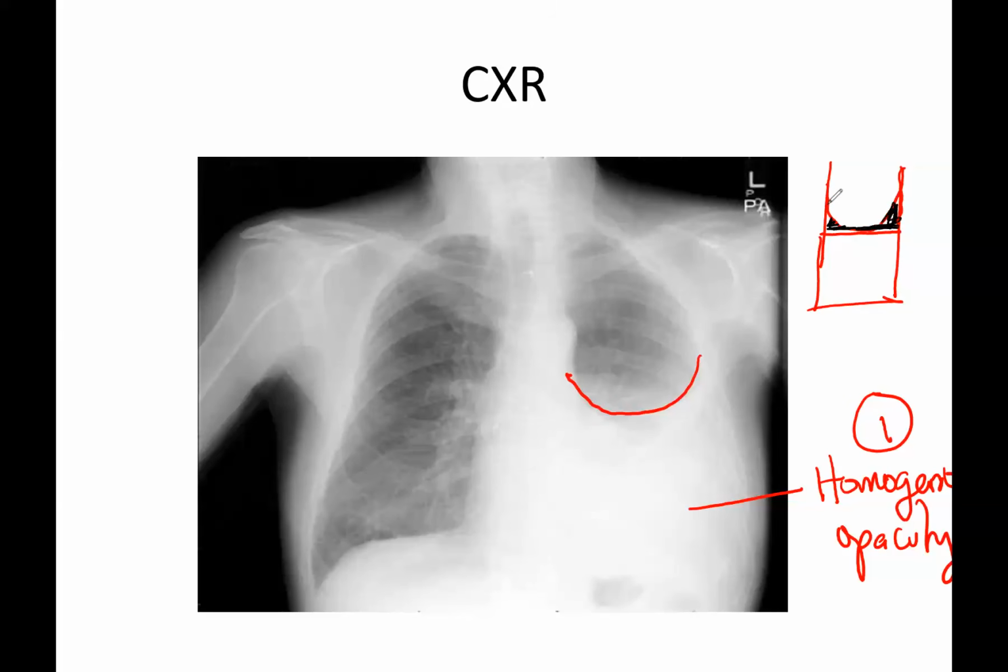This is a meniscus, signifying that there is fluid here. So you can see this is a meniscus sign. Now this is number two.